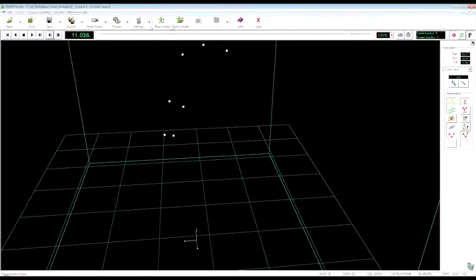Within the Smart Tracker application, you have the chance to associate a certain model of markers to a certain trial that you have just loaded into the application. So we can have a model of markers, in order to have something to which everybody can refer in the future. We have two options.